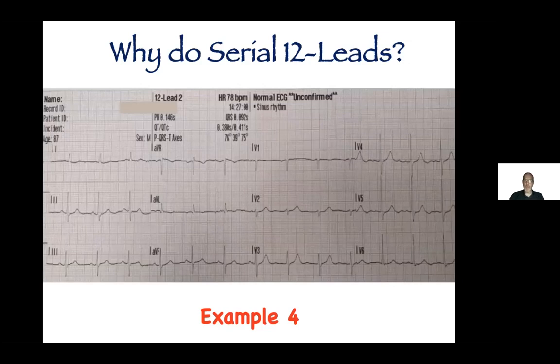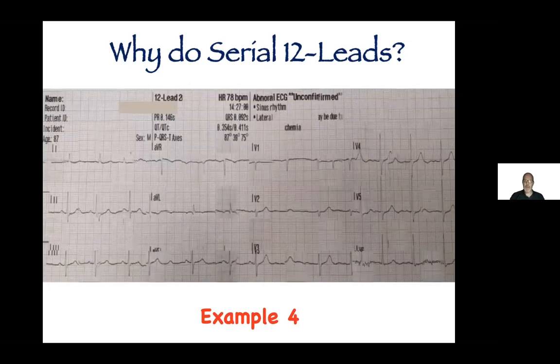Okay, so this is telling me a normal sinus rhythm. It's like, okay, I would tend to agree with that. Anything it's jumping at. So look at the next EKG. Focus on AVL. Look at lead AVL.